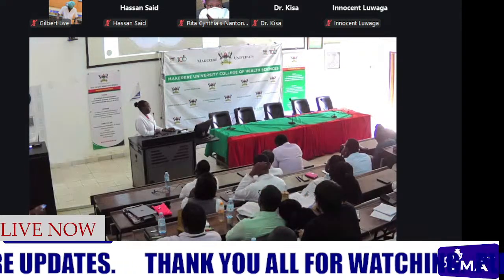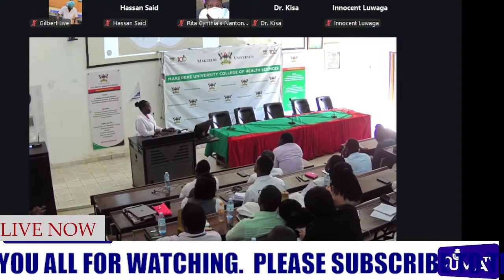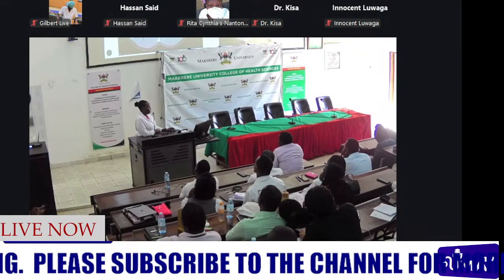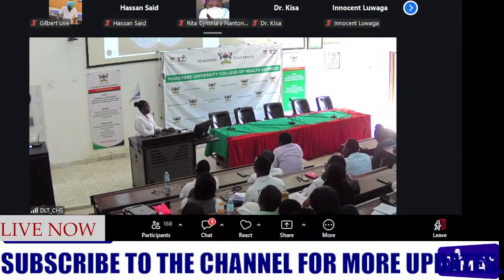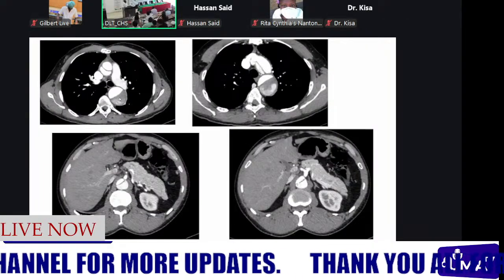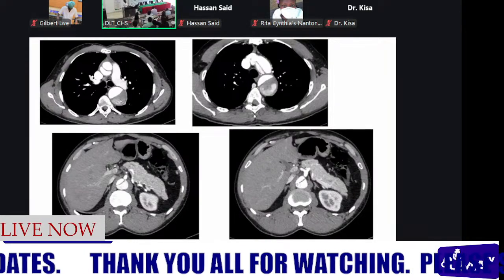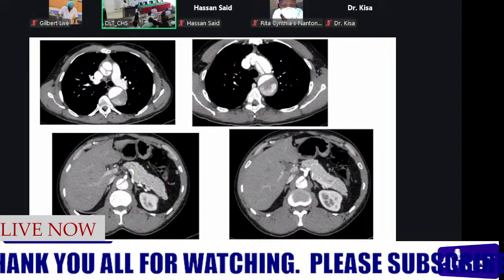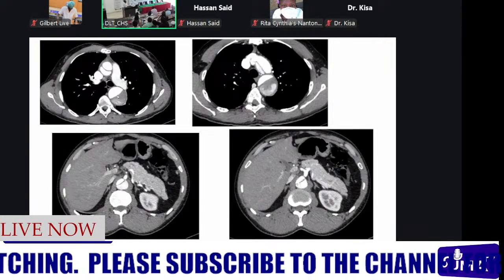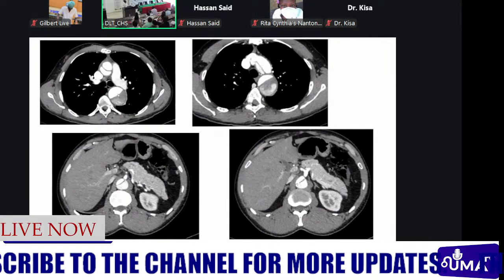We see the intimal flap within the ascending aorta, which is dividing the aortic lumen into the true lumen here, and superiorly the false lumen. Then at the level of the descending aorta, we are still able to visualize our true lumen, which is well opacified, and the false lumen here looks hypodense. The false lumen can appear differently depending on whether there is flow within it. At this point, we see it's equally bright like the true lumen because there is active flow. Then here there is usually either stasis or thrombosis that will cause a delayed enhancement or actually no enhancement.